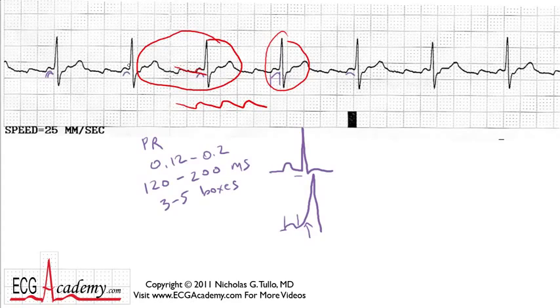Now, how do you know it's atrial flutter? Well, if you look really closely, behind this bump, there's actually another bump that looks just like it, right there. And if I take out my teeny weeny calipers and bring them on over, you can see that, well, my marks got in the way of that one. Let's measure these over here.